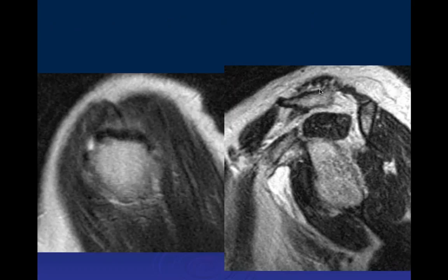So we have two sagittal MR images of the shoulder with T2 weighted imaging, and there's fluid in the subcoracoid bursa. And on the first image, there's maybe a few millimeter full thickness tear from what we can see, I suppose, of the infraspinatus. Is that, I'm sorry, anterior. So supraspinatus. So that's very good, great.